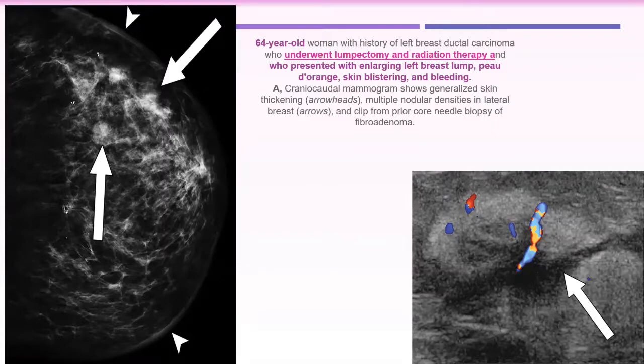The ultrasound shows a heterogeneous mass with central cystic changes, predominantly echogenic, or hyperechoic. Yes, predominantly hyperechoic, with central low echogenicity, necrosis.